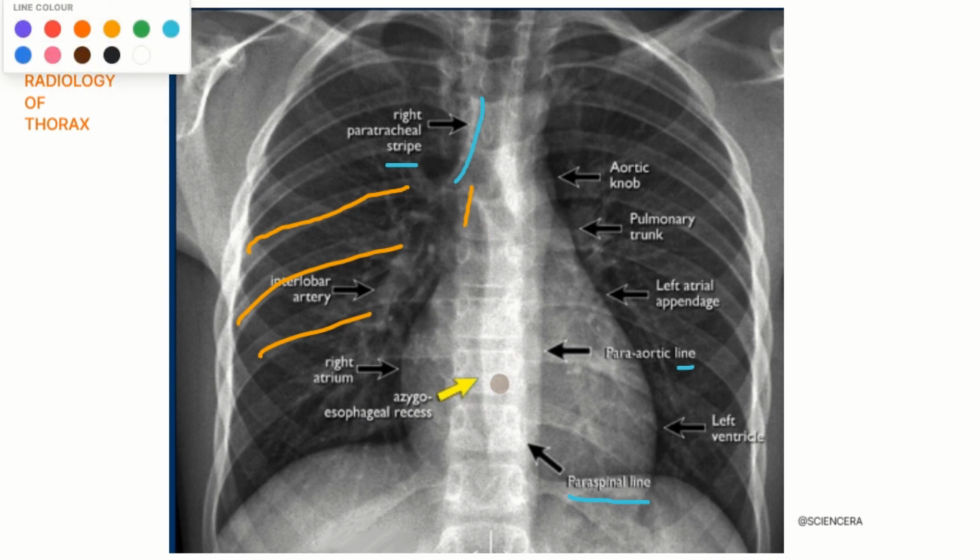It's highlighted in orange. This is the part where doctors look for the azygoesophageal recess. So if there is a problem like an abnormal growth or swelling or something wrong in the chest, this part will clearly indicate it. Doctors use these lines and shapes on the chest X-ray to spot any changes that might signal a problem in the lungs or the areas of the chest.